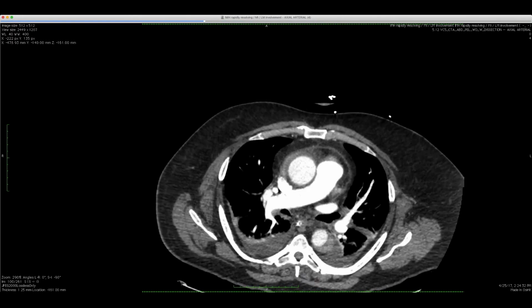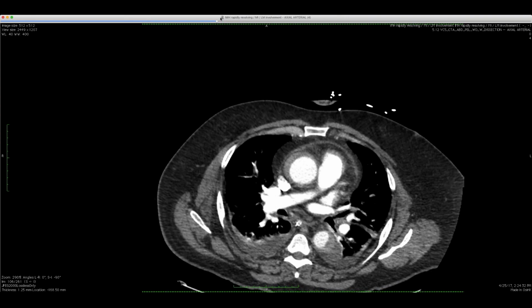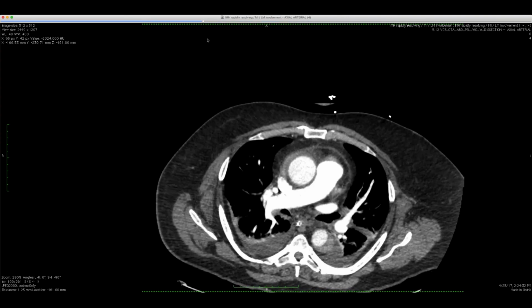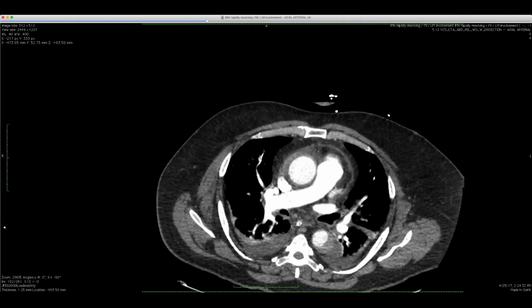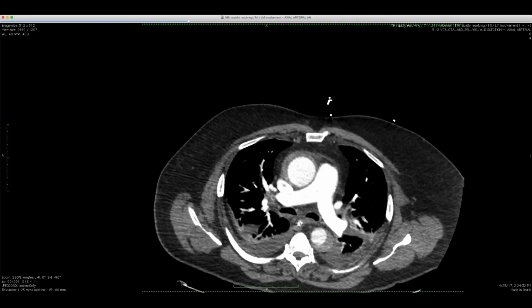I think this is an acute aortic dissection that hasn't become classic in terms of you're seeing blood flow in the false channel. But I think the rapid evolution is that you've got hematoma in the wall. The reason it wasn't dense at the beginning is the blood probably hadn't clotted, and because the aorta is beating all the time, and you've got a fluid component there, you can massage it around and spread out, and become less thick in the regions where it was most pronounced before.